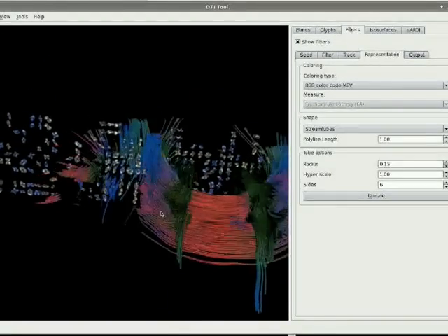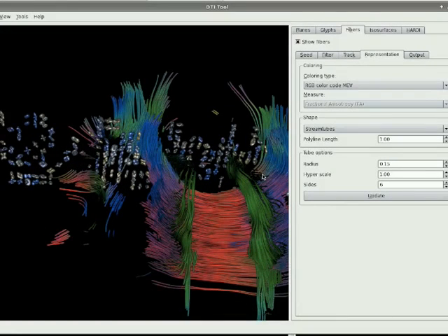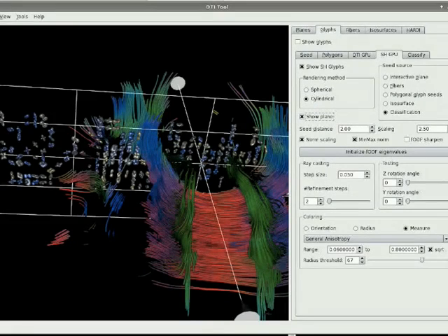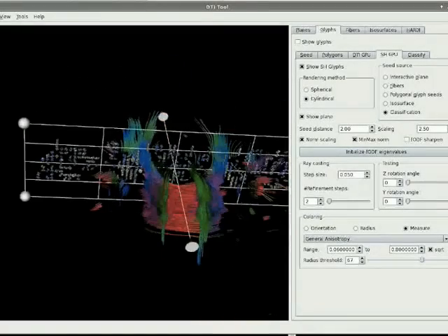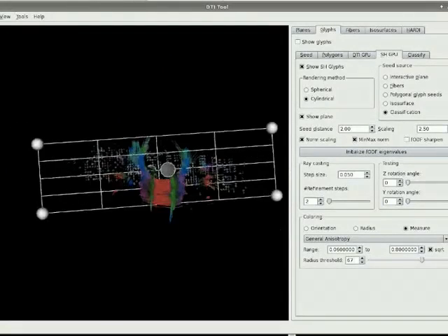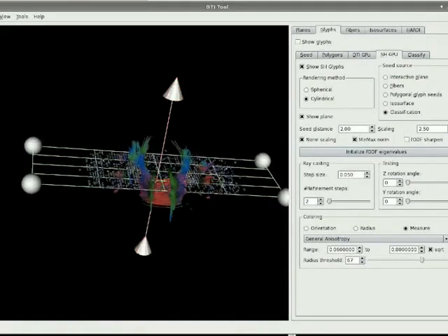Now we can explore the gaps of the fiber tracking algorithm due to the fiber tracking threshold as a stopping criteria. Only the non-Gaussian regions, or the regions classified as non-Gaussian, are represented by the local HARDI glyph information, and now we can explore that data.